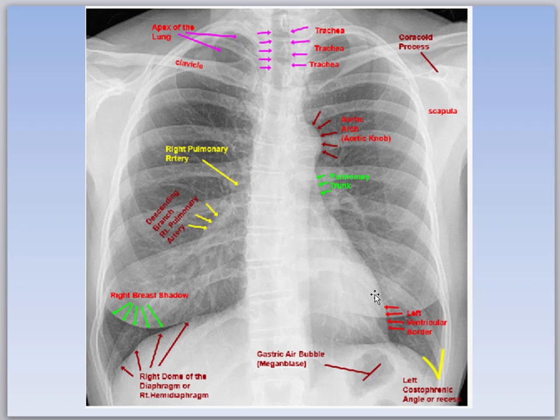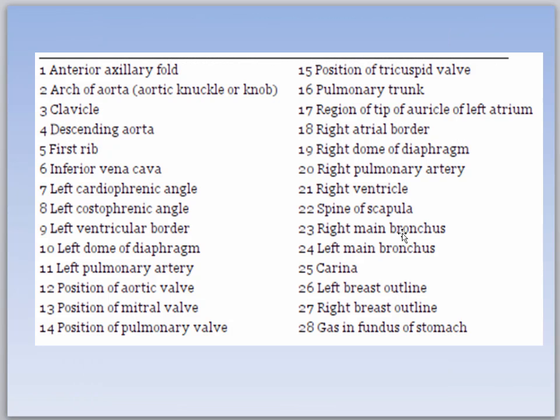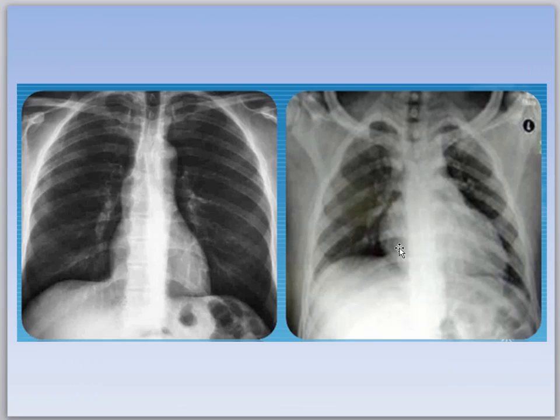Okay, I think that's probably enough for you. I want you to go through this one by yourself. This is a little bit more complicated, but we've covered most of these structures, but you'll see there's a few more of them that we haven't, so you might see this again. And I think that will do it, so good luck on your final. Oh, let me show you one more thing. We're not done yet, sorry.